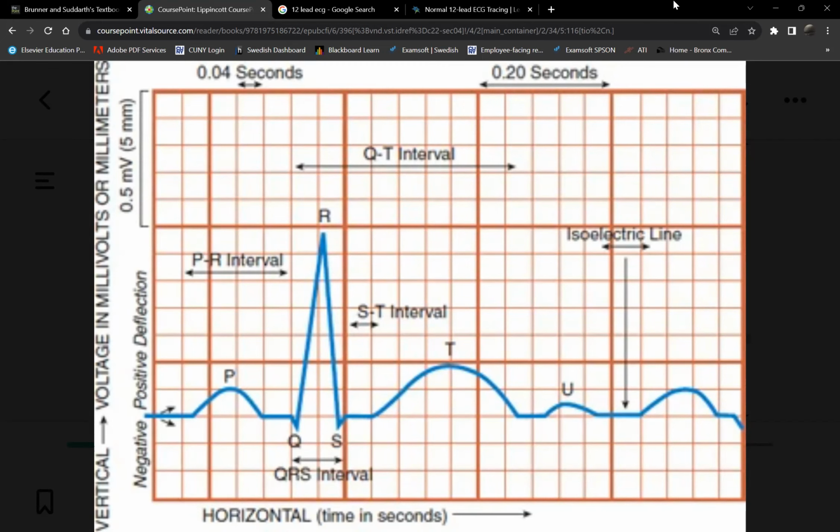Okay. Whereas if, let's say, you have another type of heart attack, wherein instead of ST elevation, you'll have something like this, which is ST depression instead. Actually, it will look more like this. This is now a non-ST elevation MI. So this means that it's still a heart attack. However, it's not transmural like this. This is transmural. So this is what we call a subendocardial heart attack.